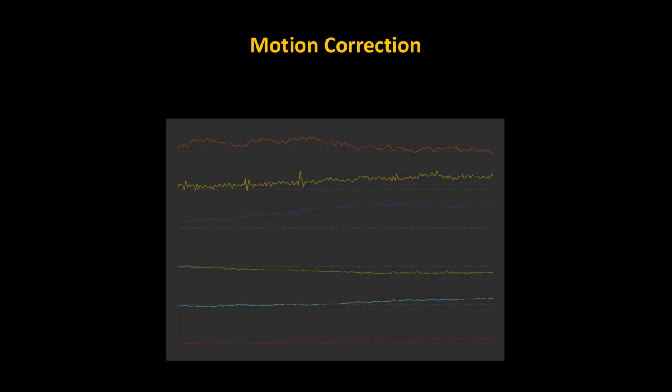So you'll get plots like these. This was the three translations, X, Y, Z directions, and also the three rotations you can have as well. So these are typically included as regressors in the model to account for those sources of variance.